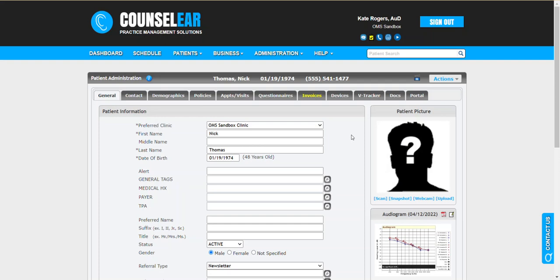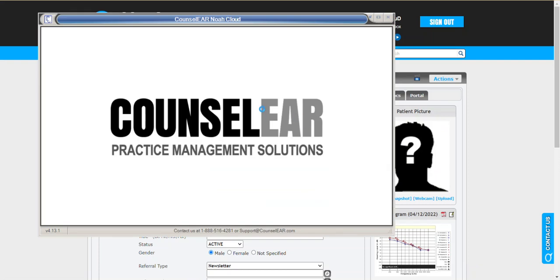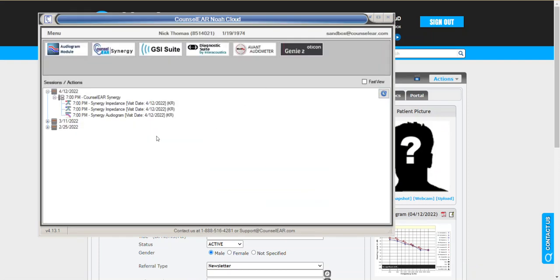Okay, so what would happen here is you would first, of course, open up Noah, your traditional method for opening up Noah. And what we want to do is save this record, because something in one of these sessions got corrupted, and it can be very difficult to figure out which one. So we're going to say, hey, let's back this whole thing out. Let's make sure it's saved.